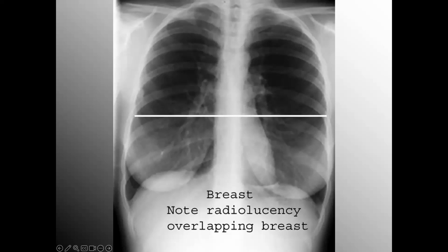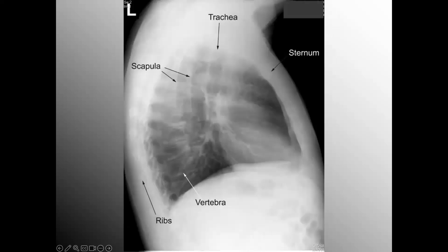Of course, you'll need to consider whether the patient was at full inspiration when the image was shot. Also worth noting, a patient with hyperinflation will often present with a lower transcardiac to transthoracic ratio compared to a patient that has cardiomegaly, where their transcardiac to transthoracic ratio well exceeds the 50%.